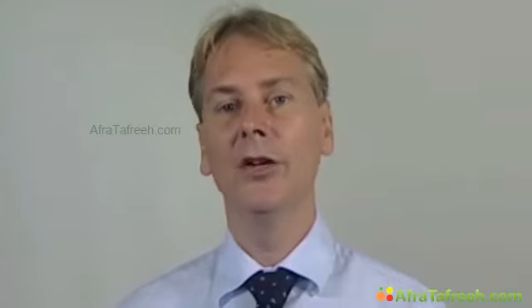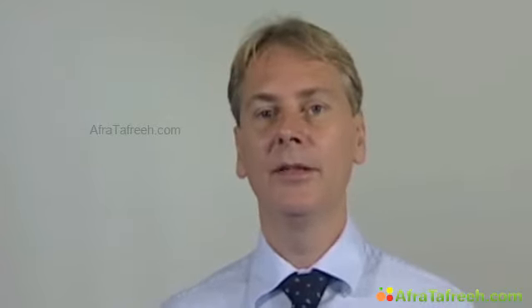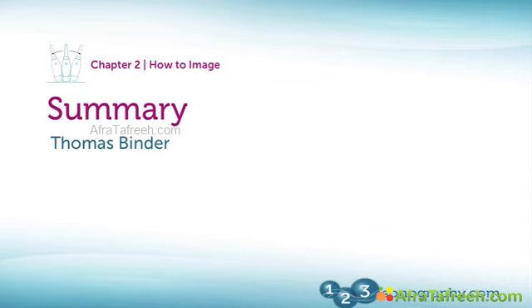So in summary, color Doppler is very important and should be an important part of every exam. I showed you some typical practical applications of color Doppler, but there are many, many more, as you will see when we come more into the pathologies, where we see the power and the full potential of color Doppler.